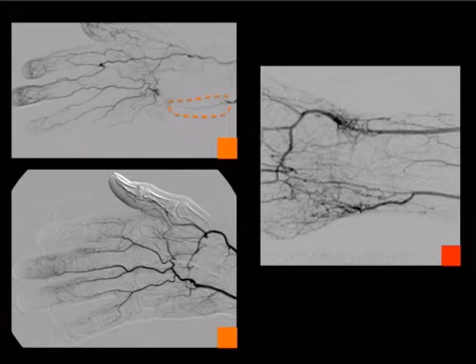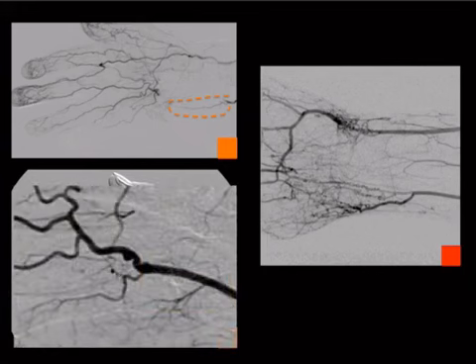Now the bottom one, still in the orange, different patient, there is a pseudoaneurysm which is formed at the distal ulnar artery with some distal emboli and abrupt occlusion of the third, fourth, and fifth digits. So we're talking about this. Take a zoom up here.